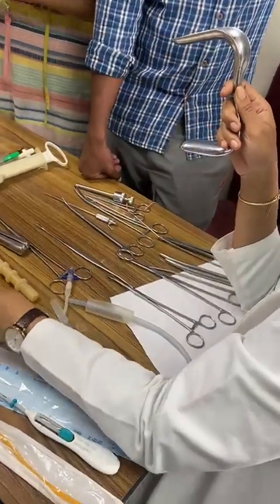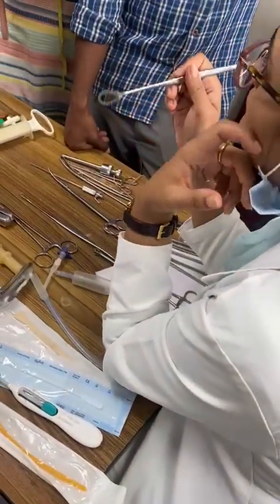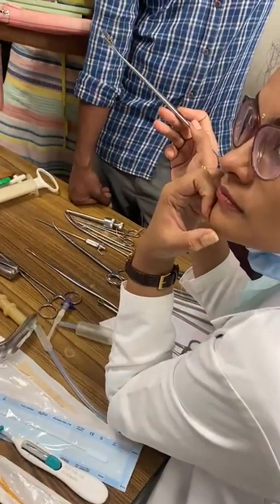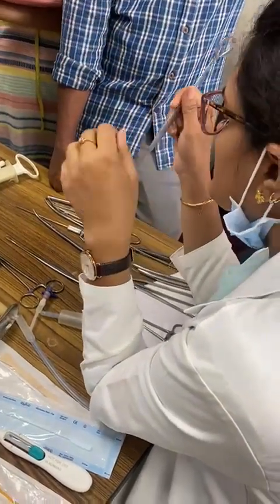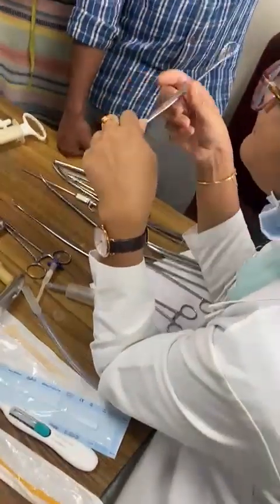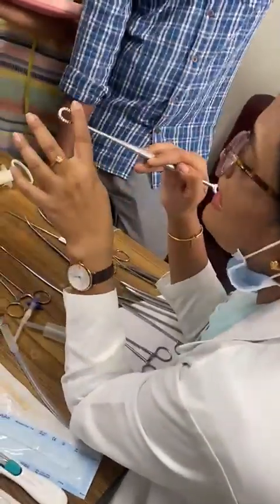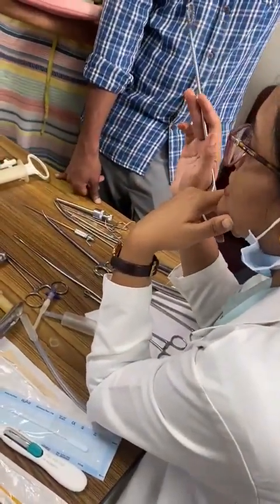Then this is an anterior vaginal wall retractor, used to retract the anterior vaginal wall when we are visualizing the cervix. Also used for the lip of the cervix. You cannot hold with this; that is a vulsellum. There is no vulsellum in this one. This is also used for blunt curetting post-delivery, because the os is thin and it has a blunt edge. So you can use it for blunt curetting post-delivery if at all they ask you.